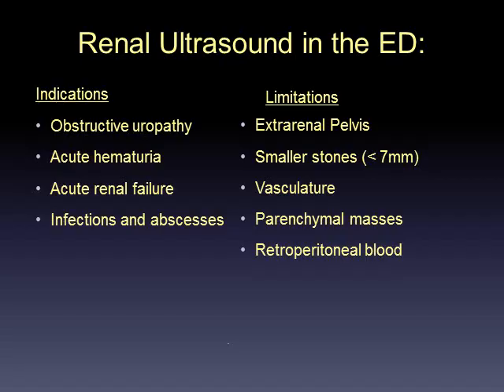On the right-hand side, we see some of the limitations. Number one there, the extrarenal pelvis and outpouching of the proximal ureter can be confused with hydronephrosis. Important to point out that ultrasound is not very sensitive for finding smaller renal stones.